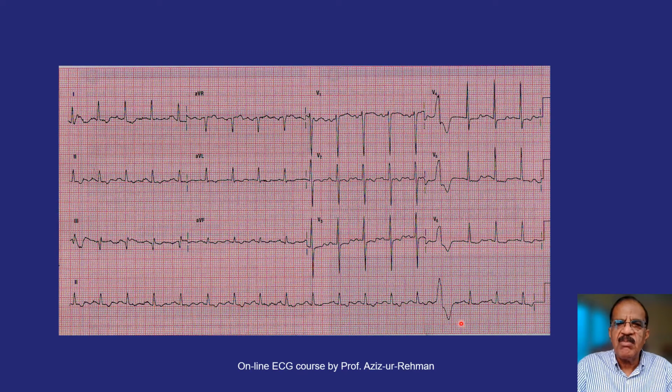But suddenly you notice something which is very different. You see a depolarization which is very different from the normal sinus beat. How is it different? It is different because it is much broader and much bigger, and it is followed by an ST and T wave which are again of different morphology, and it has come earlier than its expected time. So there is something going on. And since these leads are recorded simultaneously, the same electrical phenomenon recorded here is also depicted in these leads. So there is just one ectopic activity which is shown in all leads. This is what should draw your attention.